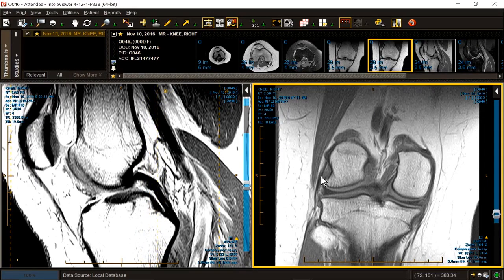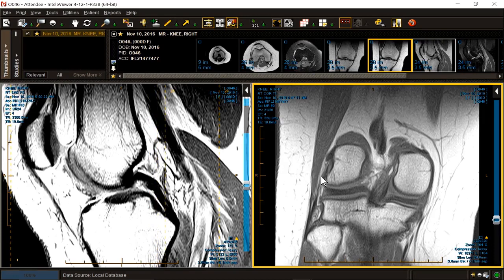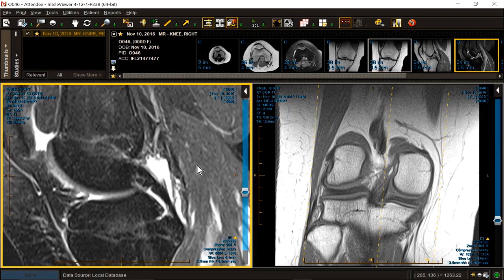So what haven't we discussed yet? The menisci. Let's do that. Where would we expect to find meniscal tears in an ACL pivot shift injury? The root might be one place. Radial tears near the root. Vertical tears near the back. And occasionally flap tears in the posterior medial meniscus.